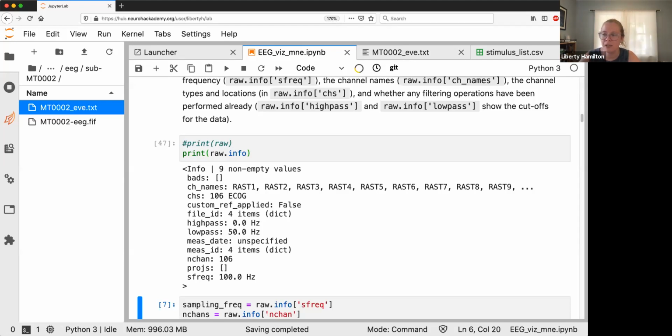I don't believe that it's doing rejection based on averages or anything like that. The warning is mostly just to tell you how many epochs are rejected. If it looks like it's rejecting most of your data, then either your data are maybe too noisy, or you need to reject less data.